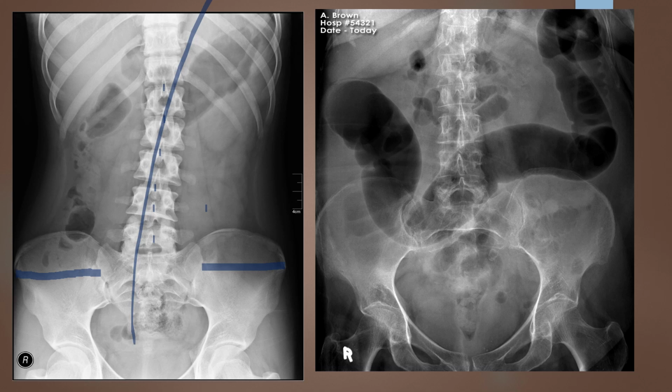It looks a lot different than our other image, but the patient has some different stuff going on. This is a much higher contrast image, but I do see the psoas muscles here and here. I can see a kidney here. I can absolutely see gas pattern here. So maybe part of what's appearing differently is that it is a different gas pattern. I can also see liver here.